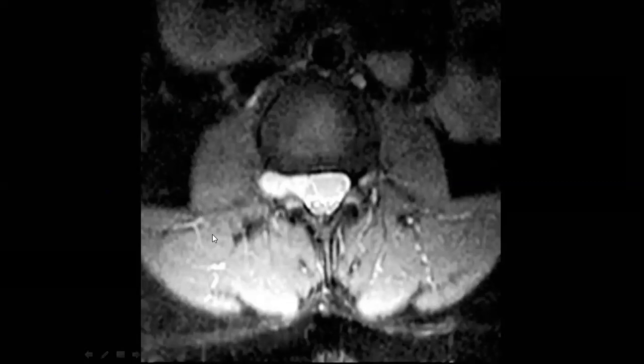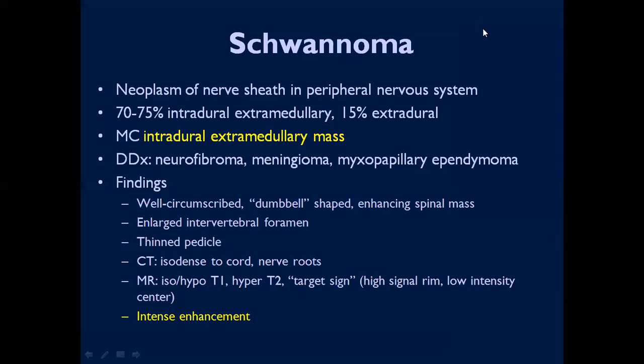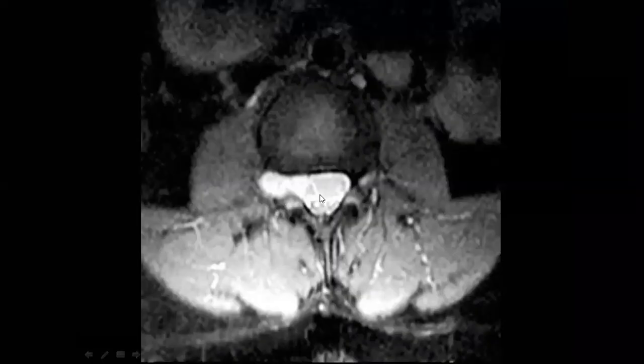Let's have a look at this. Maybe it is a short question in the exam. Yeah. Okay, Dr. Naima. Okay, Dr. Naima. Okay, so it can be Schwannoma, but to be honest, without sequence for contrast, you should. I made mute for Dr. Naima, but I don't know, it came back again.